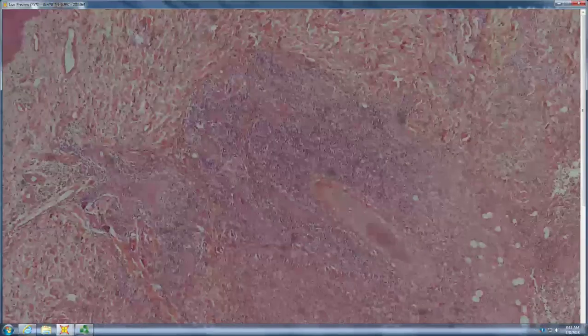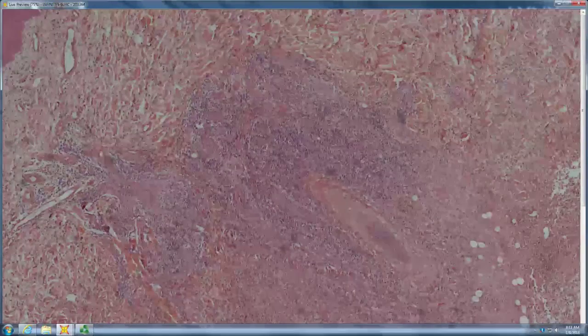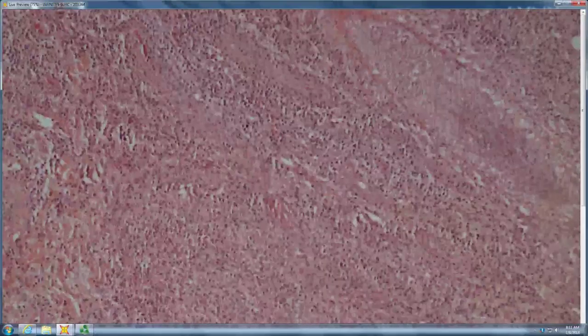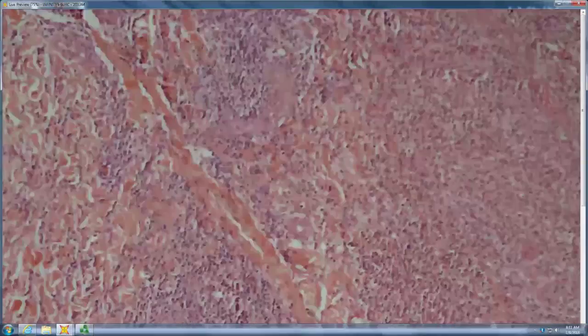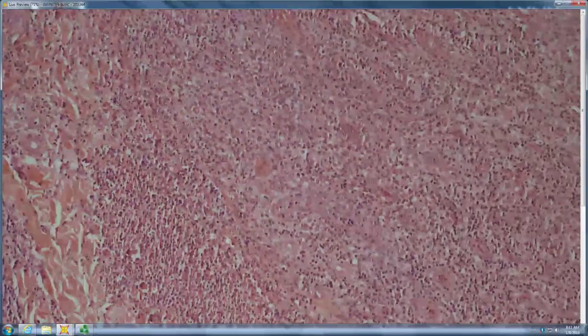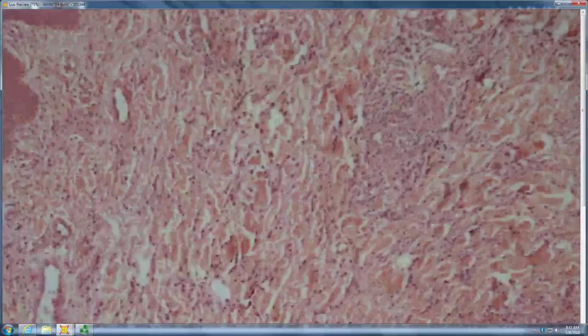Epidermis looks okay, but a little bit more deep in the dermis, there's inflammation. So it looks pretty granulomatous. There might be some neutrophils in there as well. Okay, so you're describing something suppurative and granulomatous.